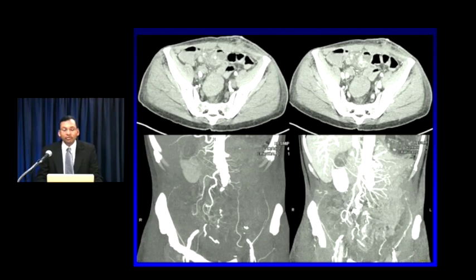If you purely rely on the axial images, it can be quite difficult to identify some of the smaller bleeds. Now, I'm a big proponent of 3D imaging, but I think that's doubly true when you're looking at a GI bleeding study. Coronal MIP reconstructions are absolutely vital, and I've seen several cases where it saved me. Here's an example of one of them, right? There's a pretty subtle bleed here in the small bowel, deep in the pelvis. It's getting bigger between the arterial and the venous phase.